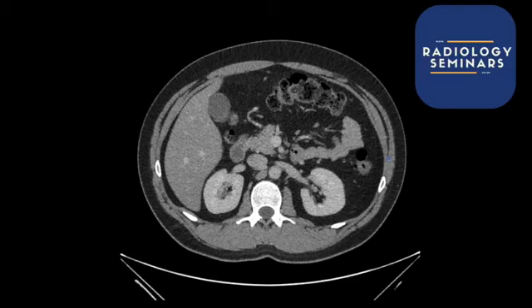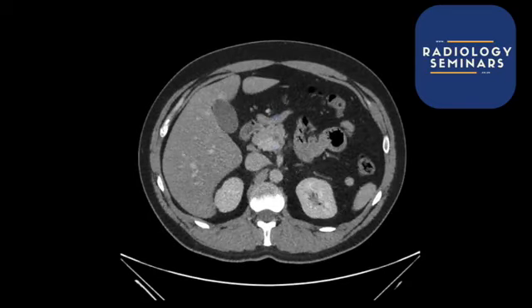So hopefully some of you may be well versed in CT scans, so it may not be that difficult. But the aorta is on the left. Okay, it's always on the left. And in radiology world, this over here is the left, and over here is the right. And so on the left will be the aorta. And I try and remember that using this really silly phrase, AOL.